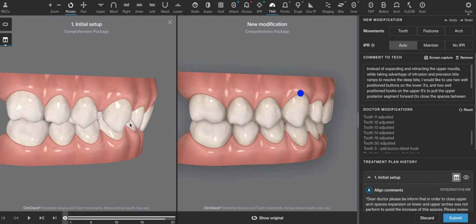This patient is too young to notice if there's any pathway wear or lingual wear on the upper anteriors, which may suggest entrapment. That's not always the case, but if it was present, we would definitely know that part of the problem of the molars being in class 2 has to do with the mandible being in a distalized position versus a skeletal or dental problem. Obviously, Ceph tracings allow us to unravel this. We will be adopting that technology soon, but as of right now, we have to use some reasoning to figure this out.